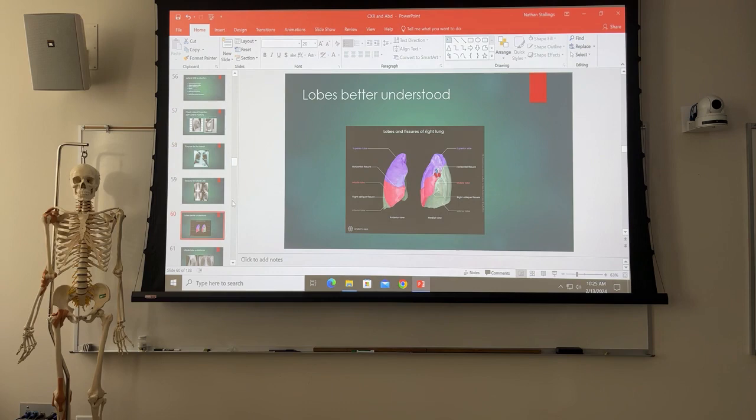So on the lateral, if it appeared pretty much in the middle of the lung, then it would probably be middle lobe. If it appeared anteriorly, it would probably be upper lobe, and if it appeared more posteriorly, it would be the lower lobe, right? So again, it gives us a little bit better of an idea of where we're looking at specific pathology.